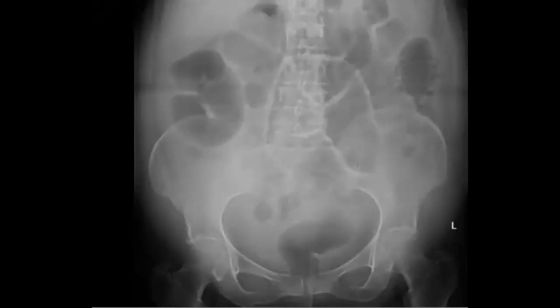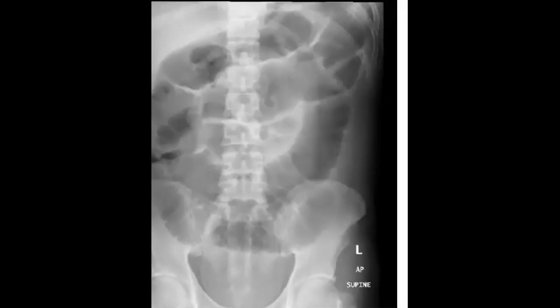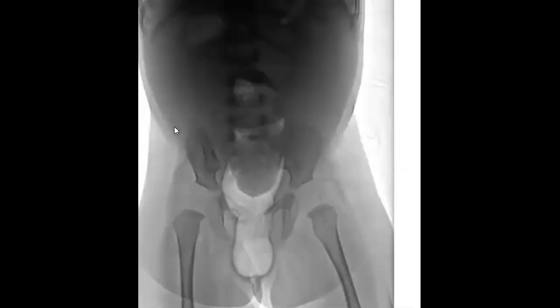It looked like small bowel obstruction. Yeah, more small, because the large should be more than 6, but I think the small bowel more. Again, small bowel obstruction, valvulae conniventes, dilated, so small bowel obstruction.